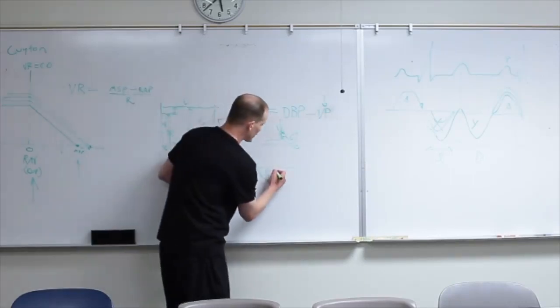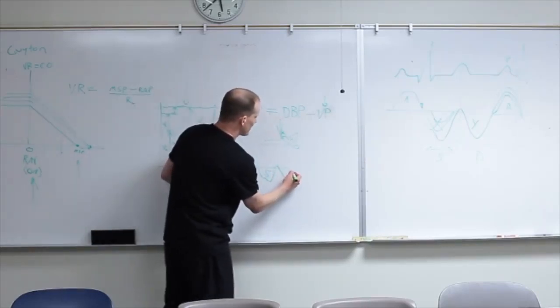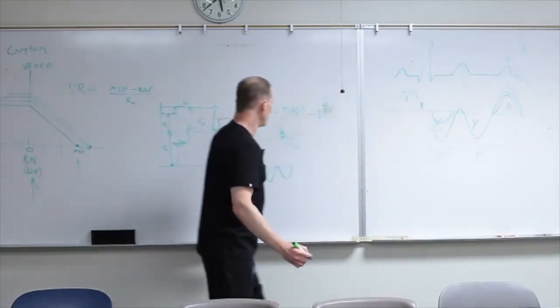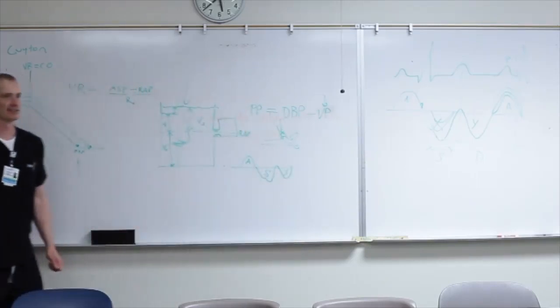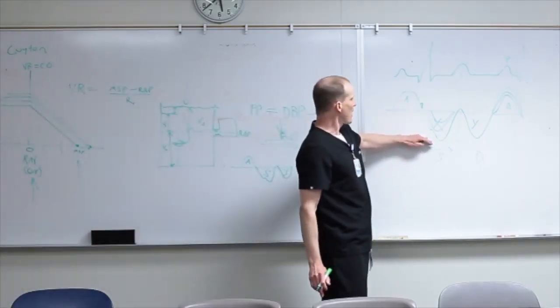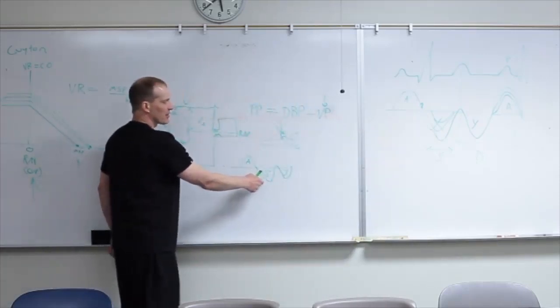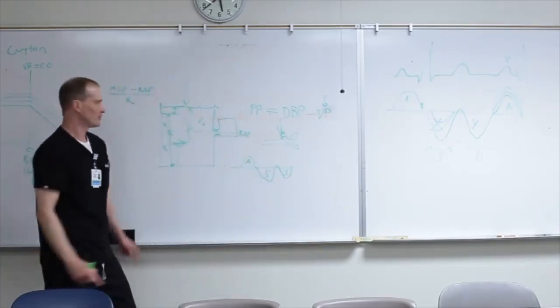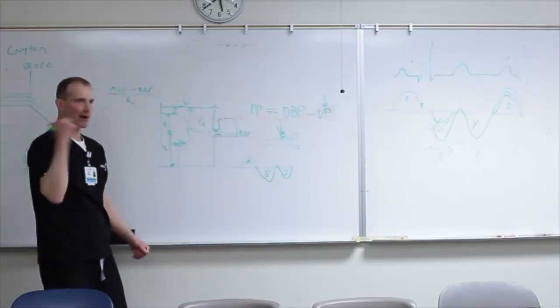And then this will return nearly to baseline, maybe go over just a little bit, and then you get this wave, which is the Y descent, and we more logically call this the D wave because it's early diastole. Okay? And just like the X descent, pressure drops get less and less as the right atrial pressures go up, this will get smaller and smaller relative to D, and this will get bigger and bigger relative to where it started at. It'll get wider and it'll get higher velocities because it's more backward flow.